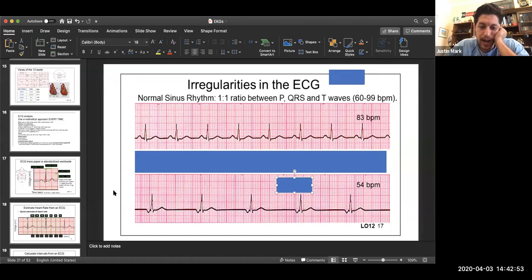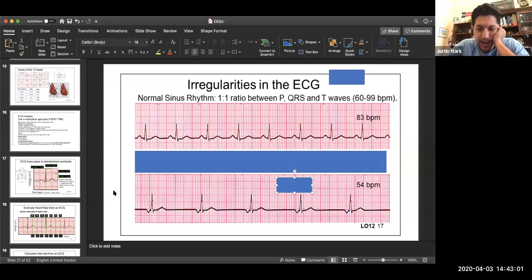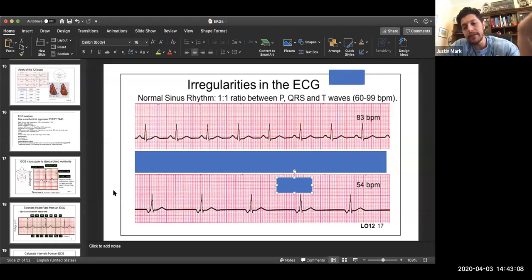But you guys just pointed out that the P waves are upside down. So what does that actually mean? Is this lead 2? The reason I'm asking is because I'm trying to think of the way the depolarization is moving. To make life easy, you could think of this as being lead 2. It's causing retrograde depolarization of the atria. That's why it's inverted. Exactly.